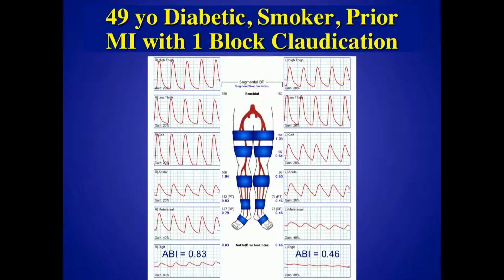So let me show you a bread and butter case, because I wasn't planning on showing much in the way of peripheral arterial, but we do a lot of peripheral artery studies. I mean, this is bread and butter for our lab. The way we approach peripheral arterial studies is we start out with the indirect exam. We don't duplex everybody. It's very time-consuming, particularly diabetic patients, patients with question claudication. If you start doing bilateral lower extremity arterial Dopplers, it's a drain on the lab, particularly when you're very busy. So we start out with the indirect studies.